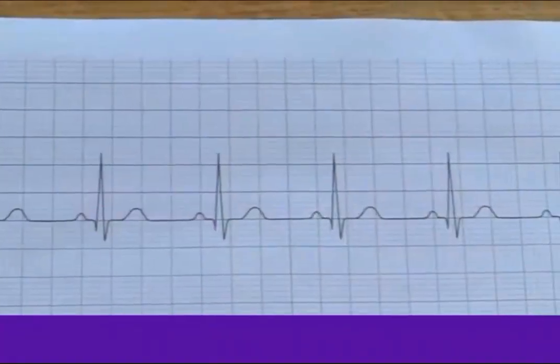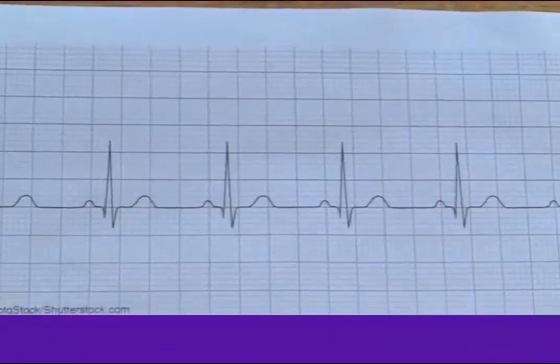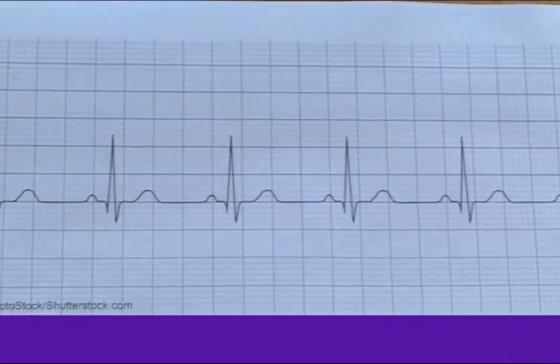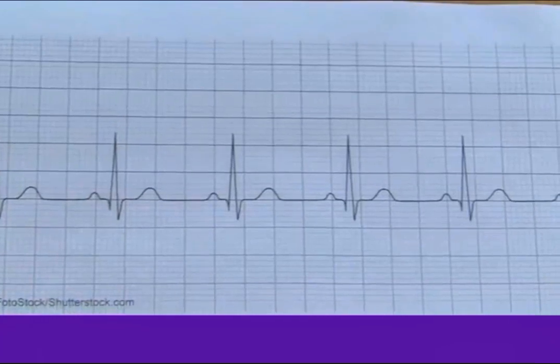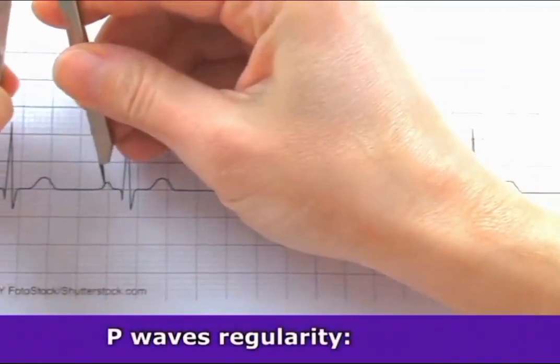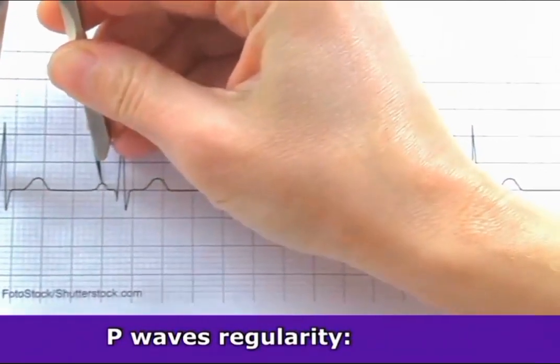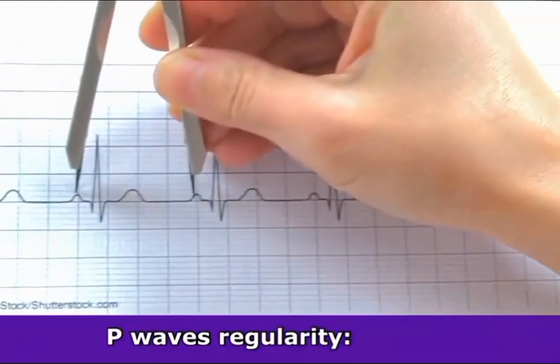So now let's analyze this rhythm using those questions that we just went over. So I have a 6-second strip here, and the first thing we want to look at are those P waves. So we're going to look at the 3 R's of the P waves, the regularity. We're going to start at the first P wave, and we're going to take our calipers. We're going to put 1 point of our calipers on that P wave, and then we're going to stretch the other part out so it touches the next P wave. And then what we're going to do is just go down through the strip and make sure they have the same distance within them. So here we go.